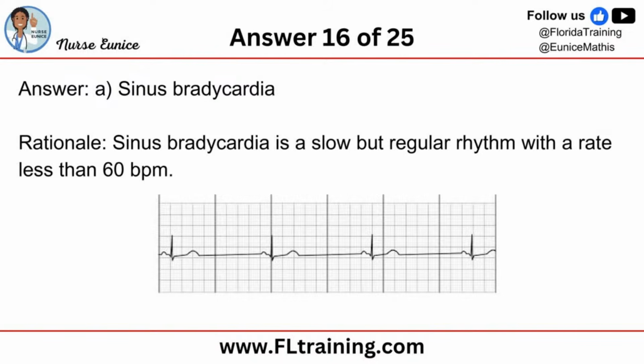Tell me how many you counted, and then whatever you count, multiply it by 10, and that would be the count for 1 full minute. And yes, for this one, it's not the dark black lines. It is the QRS complex, it's the very peak. And so there are only 4 present. So that means that this patient's heart rate is approximately 40 beats per minute.